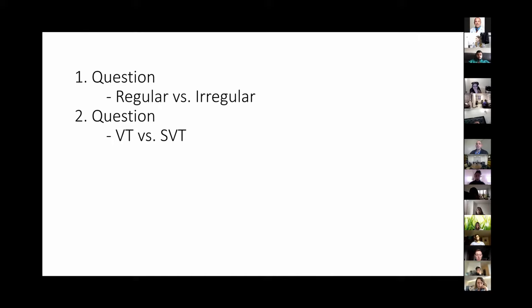Then you need to answer your question whether what you're seeing is a ventricular tachycardia, meaning there's an abnormal circuit or abnormal activity in the ventricles, versus supraventricular tachycardia that is driving your ventricular QRS complexes, and that's what you're seeing. And for that, there's a whole list of things that we have to go through that you have to also actively look for in the EKG.